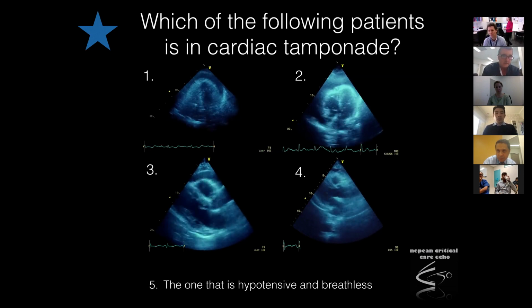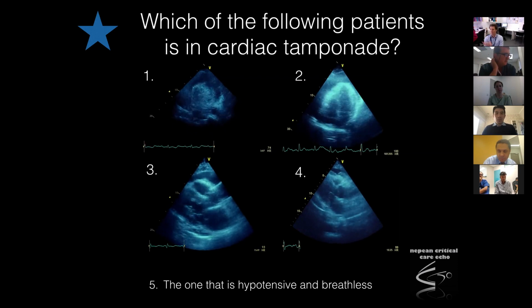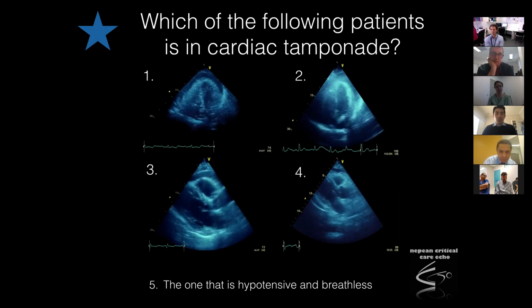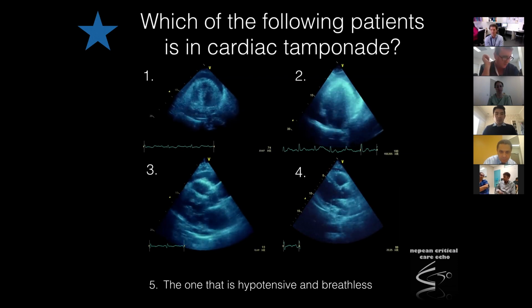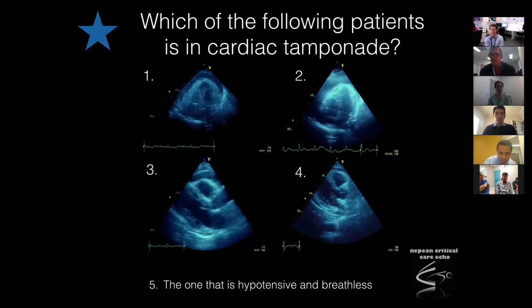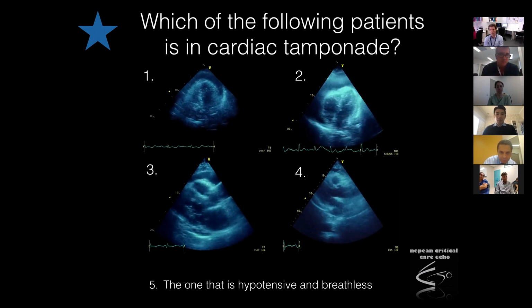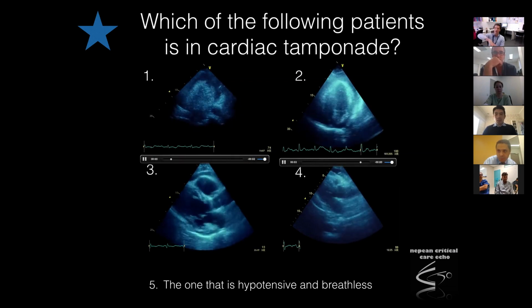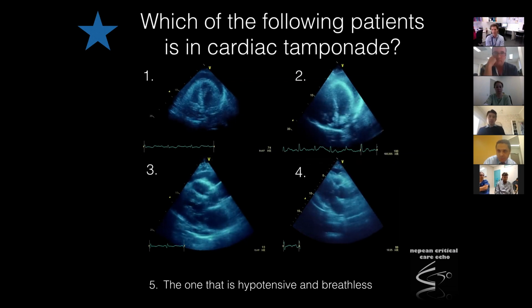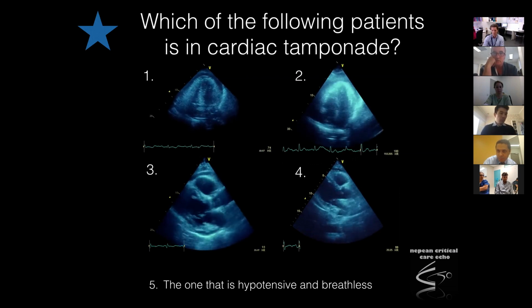And what are your cutoffs for mild, moderate, and severe? I've got 1 and 2 centimeters in my mind. Less than 1 is mild, 1 to 2 is moderate, and greater than 2 is severe. And I think greater than 3 is very severe. Yeah, I just had 1 and 2, just like you, and absolutely, if it's getting greater than 3, like we can see in this case up here, number 2, that heart swinging around like a yo-yo is another sign of significant pericardial effusion.